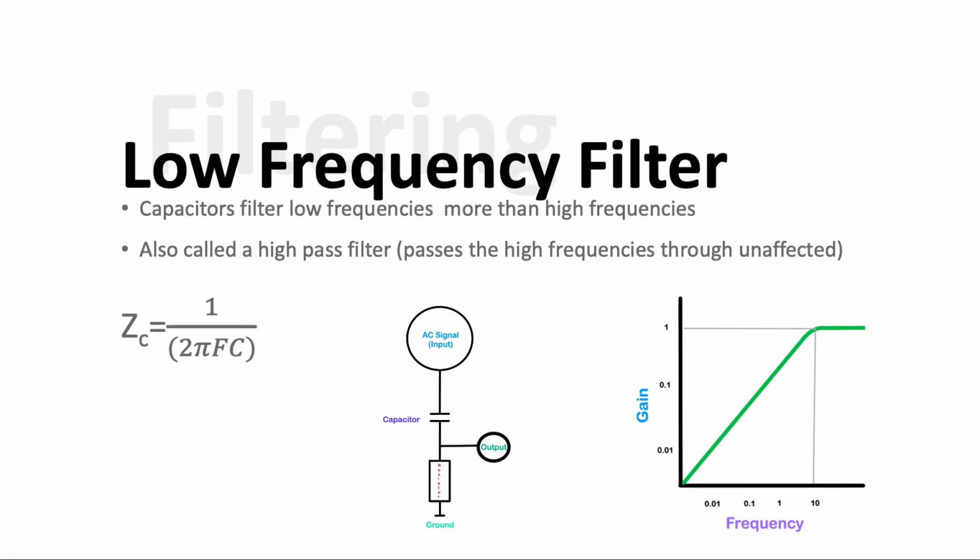I want to briefly review how filters work during this lecture. These models for filtering are old school analog filters, and while digital filtering is done differently, this does give us a good conceptual model to understand what is happening when we filter a signal. Filters do have the ability to radically change how the signal appears to the EEG reader.